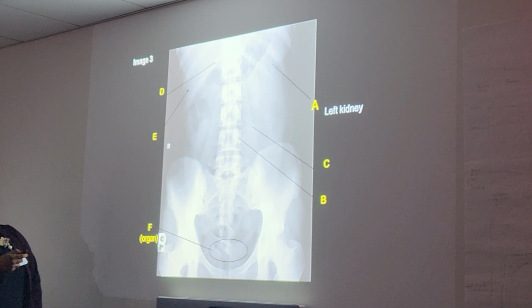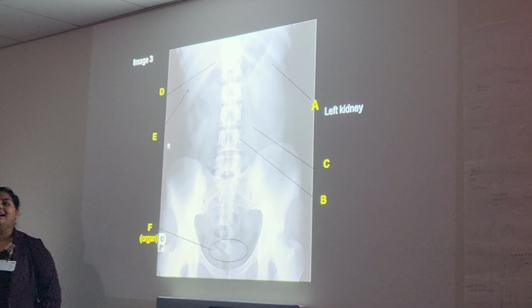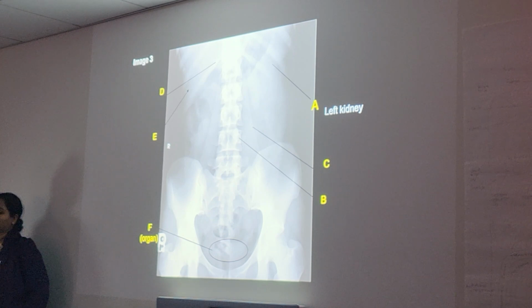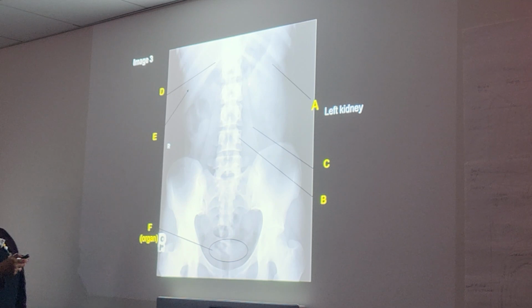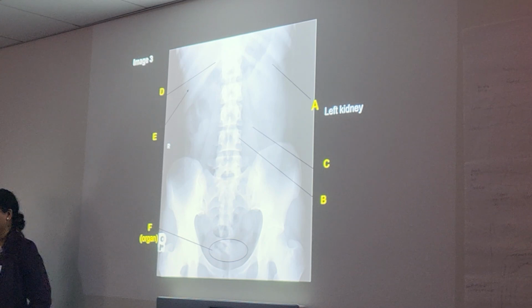Do you guys see this gray outline right here? Hardly. Imagine on the test, I would say organ, so that way you'll know what I'm talking about. Can you outline it again one more time, please? That's way too big to be a kidney. Here is where the gray shadow begins. I could barely see. So then the other one would be here. That's correct. All right, what's B?